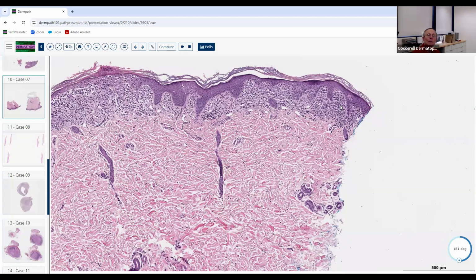So what do you think about when I say lichenoid granulomatous? What about lichenoid drug or like BLK? Lichenoid drug, if you want to be right, you can always say drug. So it's possible, but lichenoid drug usually gives you lichenoid with lymphs. It actually looks more like lichen planus. It's not really classic lichenoid granulomatous, but that's kind of cheating because it's always right. But there are about 3 or 4 other diseases. They're not like 20. It's a short list. Lupus, fixed drug?